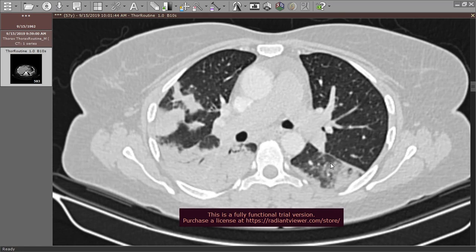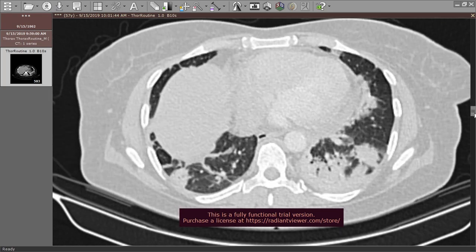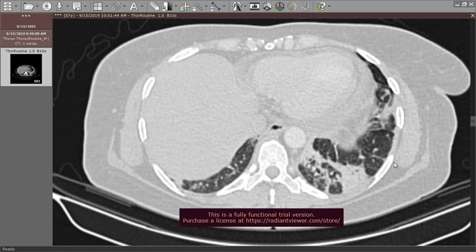Sometimes there is a ground glass halo around this pneumonia, representing an element of alveolitis or reaction of the alveolar system around this consolidation or infection. These linear bands are called coarse atelectatic plates, because they are thick. And the consolidation also may take a triangular shape.